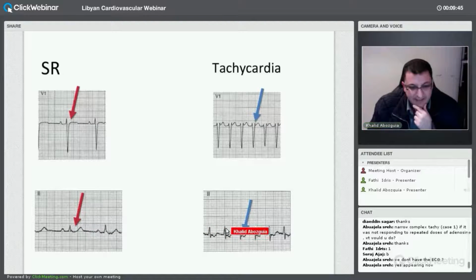Whereas during tachycardia, you have QRS, a negative deflection, which is likely to be the retrograde P wave, and then your positive T wave. So this is likely to represent a retrograde atrial activation, what we call a retrograde P wave. And in V1, you could see it positive here. So when you compare it to the resting ECG, you don't see it. So we call it an R prime, which is very, very characteristic of typical AVNRT.